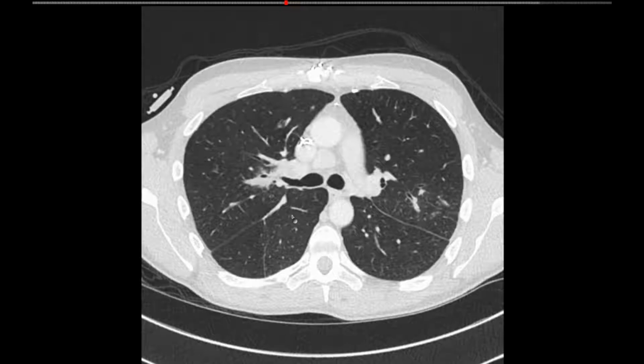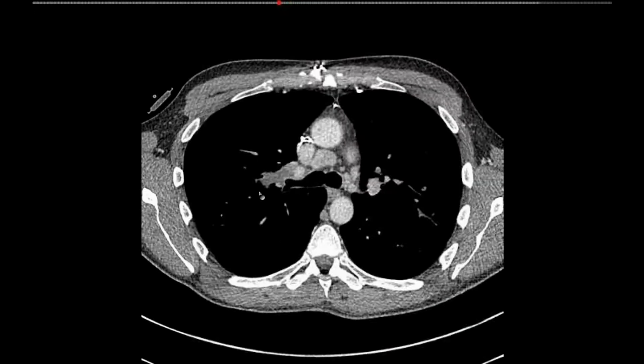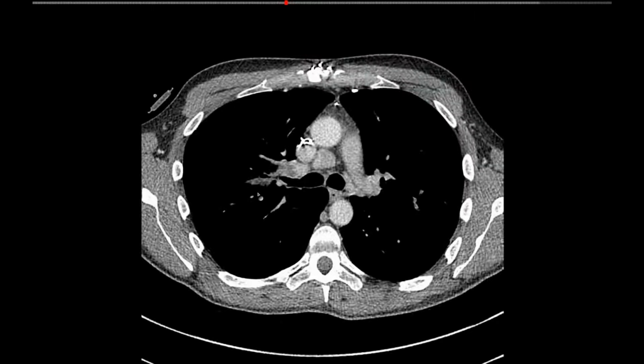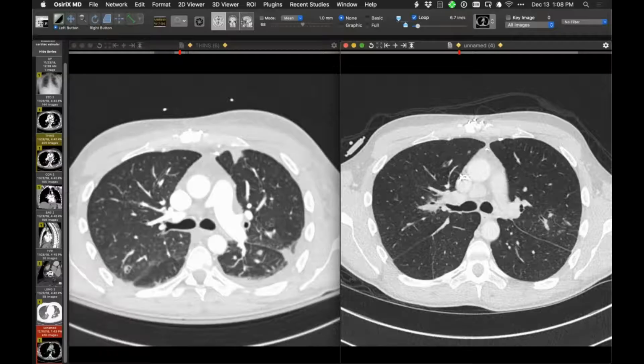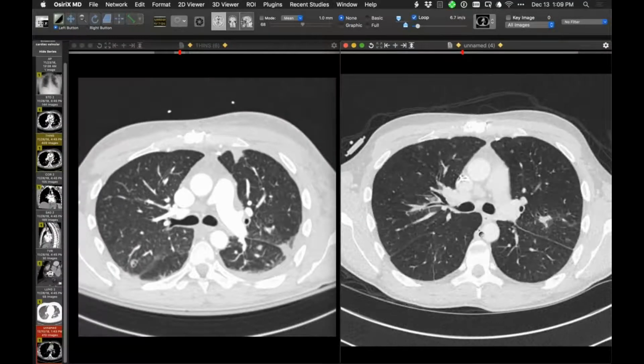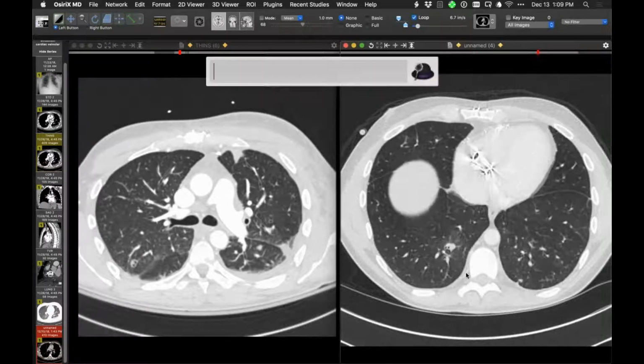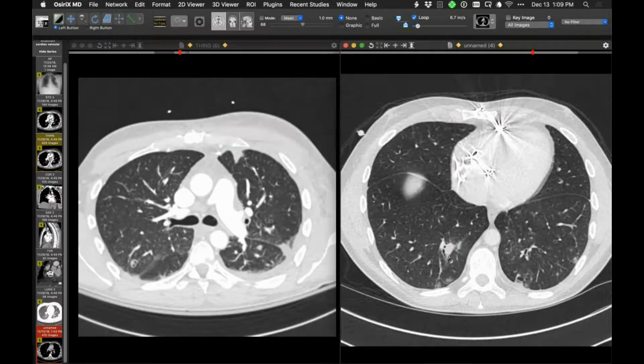Let me go to this again, say like that. So I'm showing you right there. Yeah, they almost look like pulmonary emboli where they expand the vessel, but I think you're right in that they're sort of infected clots, and you wonder if it's sort of undermining the vessel wall and you're starting to develop an abscess, or maybe it's just an inflammatory response. But yeah, that's really interesting.